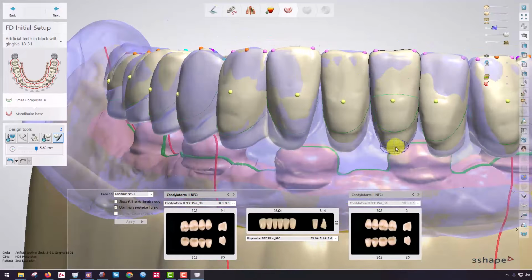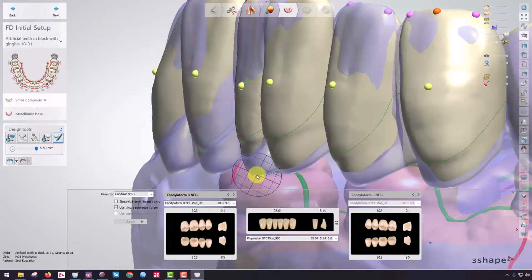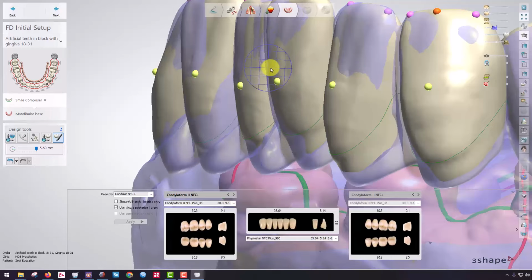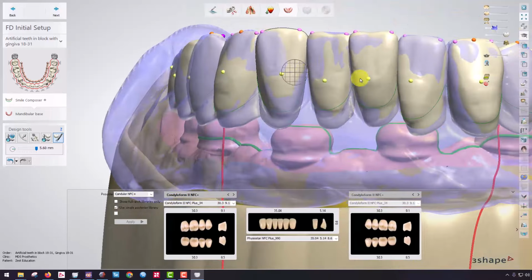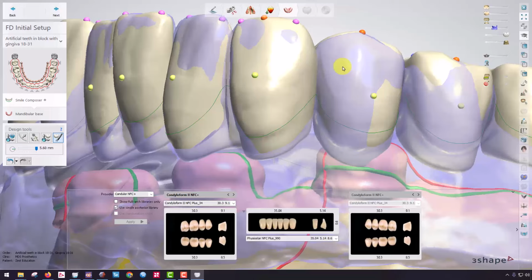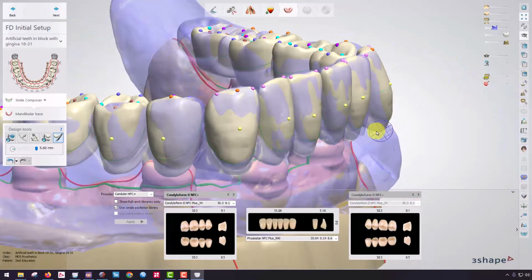And then same thing in here. Maybe I'll bring that across. Maybe I'm a little bit too puffy right in here. Bring that back, bring that forward, bring this out a little bit, like so. And I'm aligning these colored areas together. This will give me a preview of where my patient's original reference denture is and where that prosthesis is going to go.